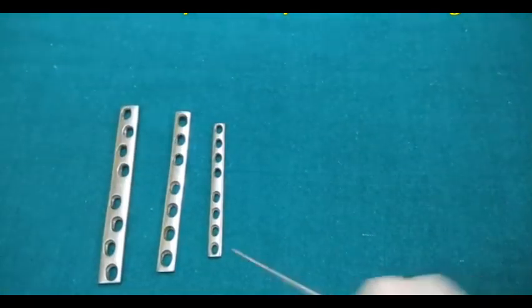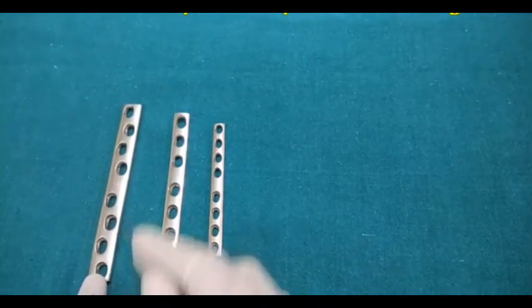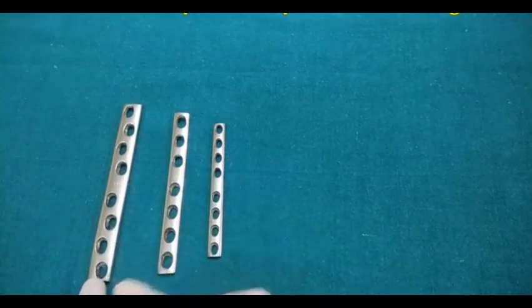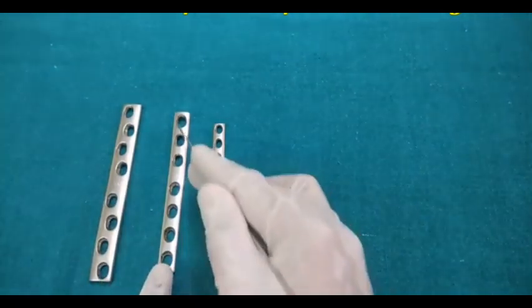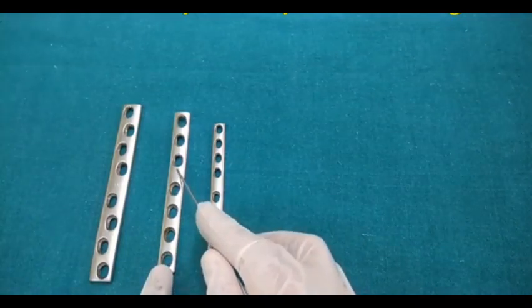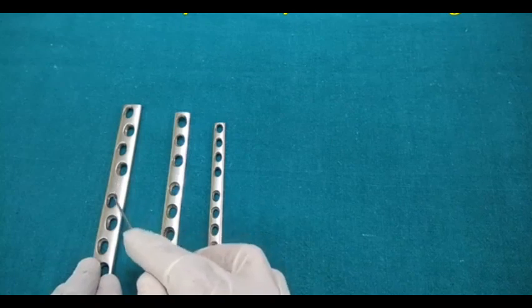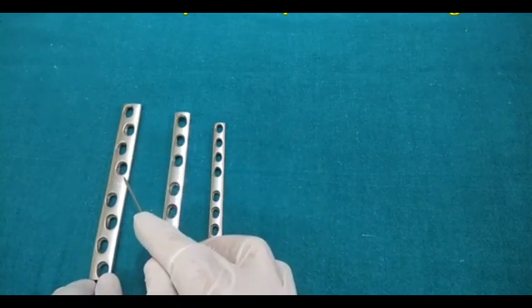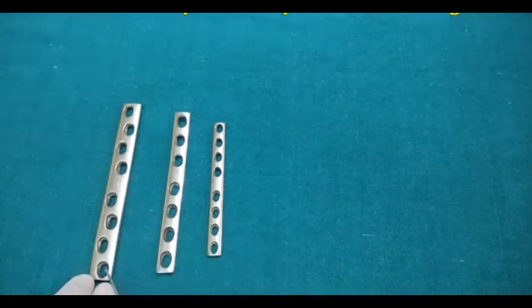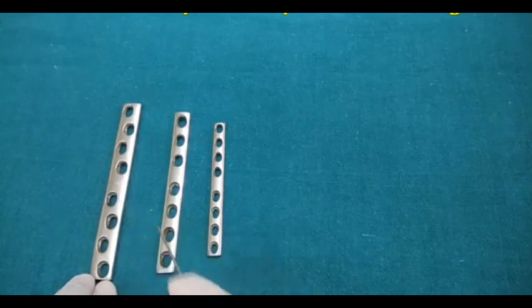How to identify the DCP: the broad and narrow are identified based upon the orientation of the screw holes. You can see that they have a zigzag pattern, that is the broad DCP, whereas this one has a straight pattern. The DCP usually has screws with a spacing in between the proximal and the distal fragment. You can see here that there is no hole. It is for the fracture site, so the fracture site will come over here. These holes are for one side of the fracture, that is the proximal fragment. This side is for the distal fragment. Like this they have divided it, and this space they have left to accommodate the fracture site.